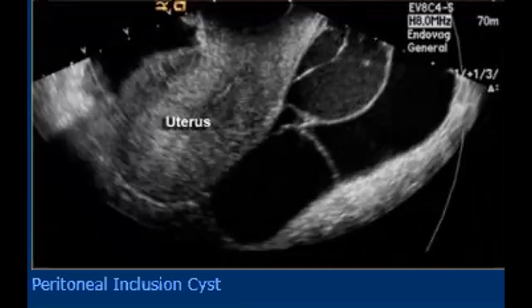They make it by exclusion. After you exclude everything, you can think about it. Multilocular lesion with enhancing septi, and it is related to the uterus. So, and it can extend to the upper abdomen. So you just think about something called peritoneal inclusion cyst.